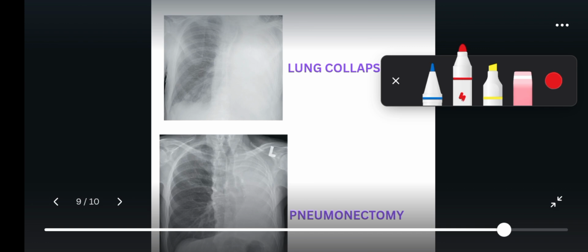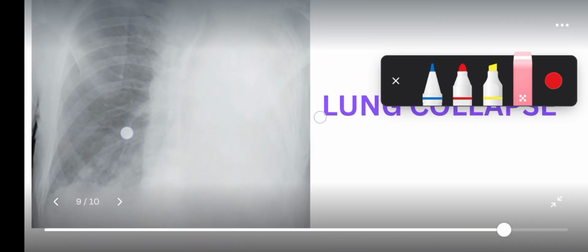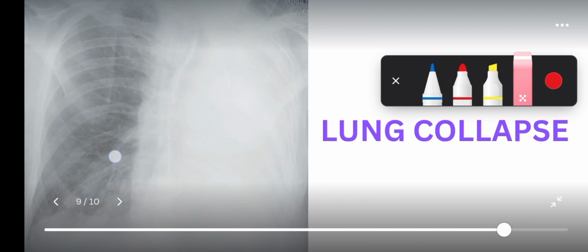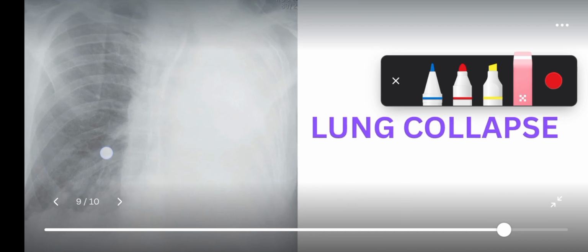You can see the bronchus shifted to this side. You can't even appreciate any sign of heart border in this right side. All of them are being shifted to the collapse region, the side. Then of course we see the opacification. And if you look inside, we cannot appreciate any air bronchogram. They appear uniformly opacified, except for this bronchus we are seeing here.